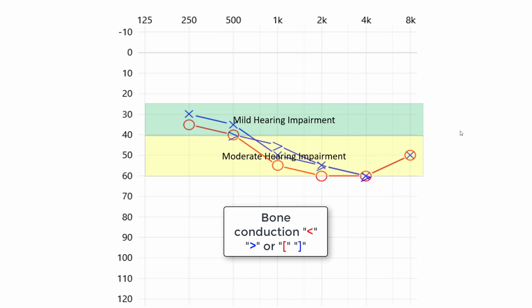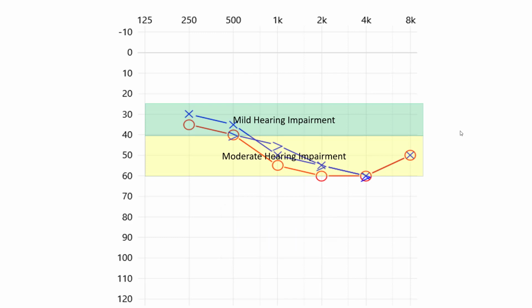You can see the bone conduction results here, shown in blue. They look like a greater than symbol. And we can see at 500 Hz, 1 kHz, 2 kHz and 4 kHz, although they overlap a lot with the circles and crosses, that there are individual measurements of the patient's bone conduction. So what does bone conduction mean? Well, as stated before, the circles and crosses are measurements made with a headphone or insert phone inserted into the ear, creating sound in the normal fashion.